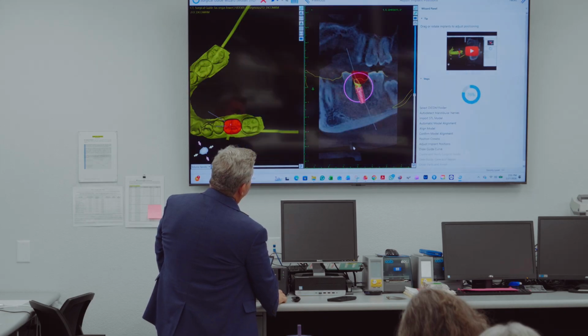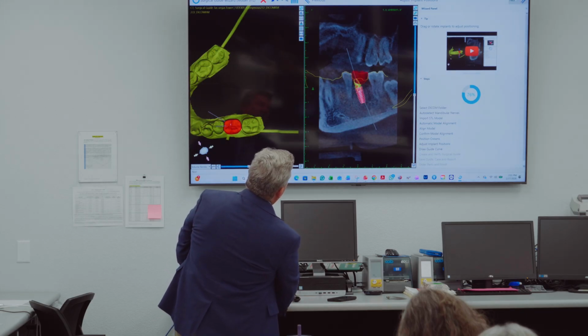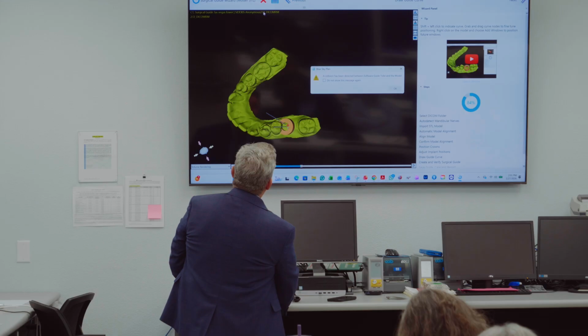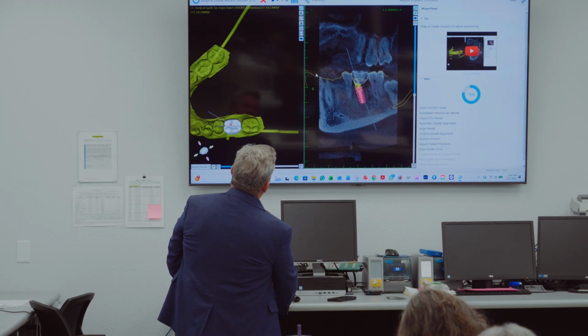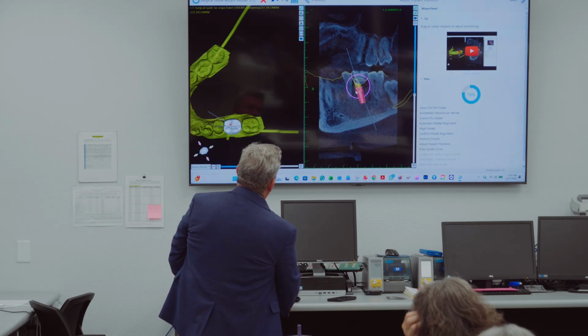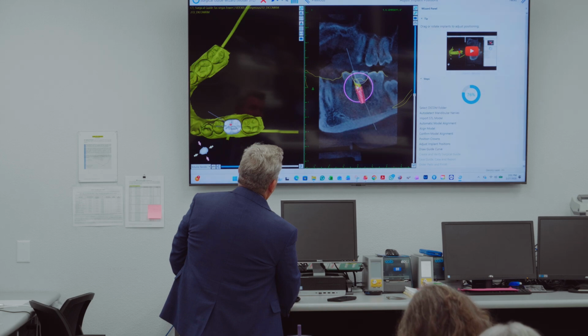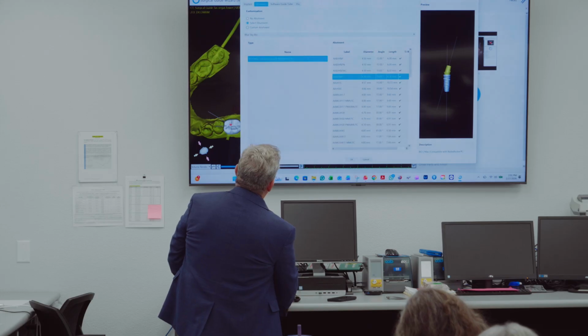Take that one here. Oh, you know what? I've got to go here and it'll show it. Let me go back. There it goes. No, it's not taking it. Why is it not taking the abutment? Oh, I know. I think it's locked. Lock implant? No. Place abutment. Let's see, try tie base.